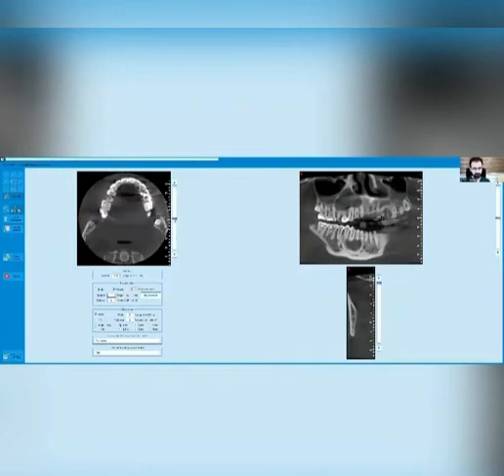From the lower arch, we have to start from the most posterior part. You can use a zoom in, just in case you don't see the nerve, the canal. Move up and down until you see the canal in the most posterior part of the arch. So now, as you can see, this is going to be the canal. We have clicked on the freehand and multiple here, and we start from this part, the most posterior part. This is the canal.